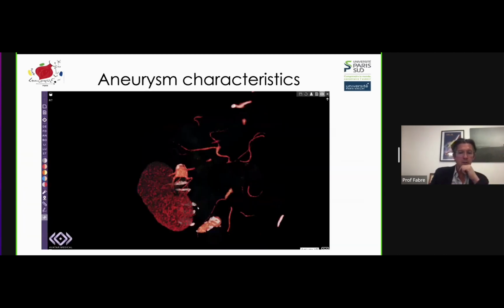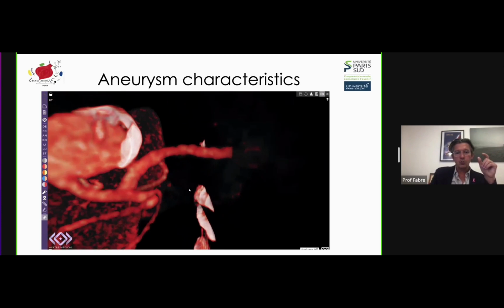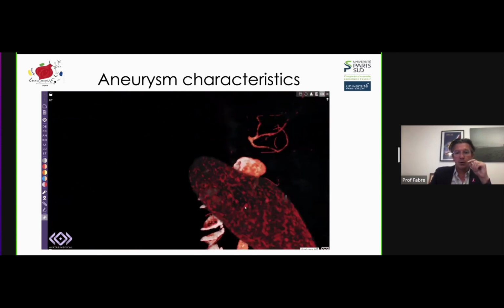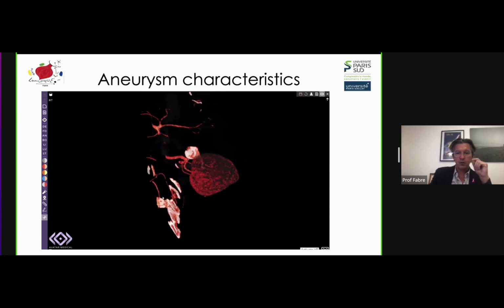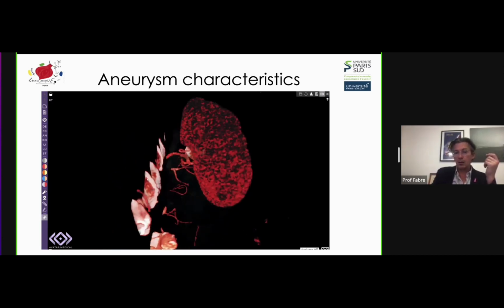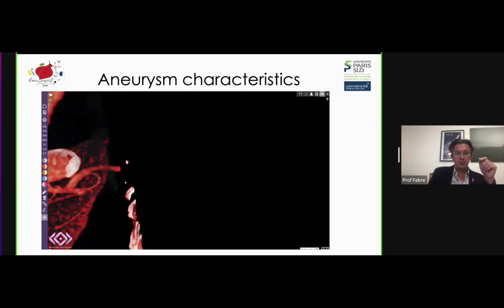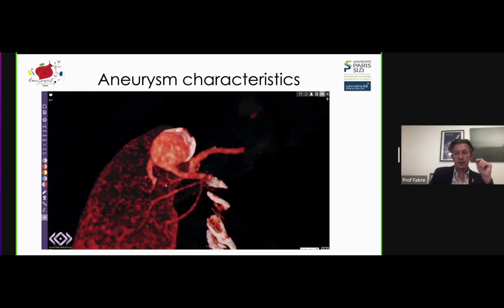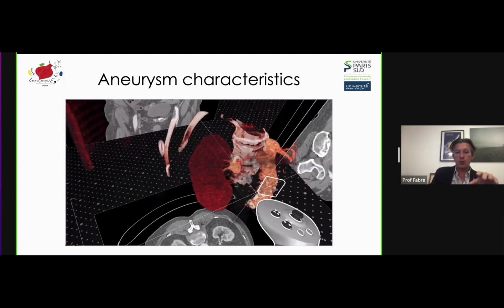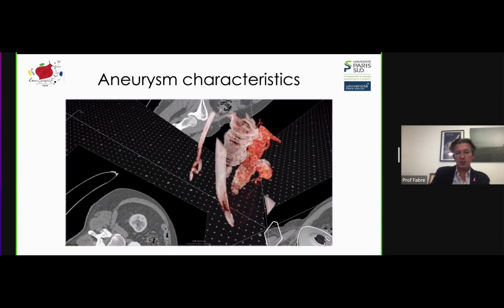But indeed, this is the image that we can have with the Avatar, but you need to imagine that it's a 3D view, and you can see all the afferent and efferent branches, and what kind of branch you can keep. I think it's the same approach for cerebral aneurysm. For cerebral aneurysm, you need to keep all the branches patent, and it's more challenging, but in this case, in a patient with a bad renal function, we also need to keep all the branches patent. So you have this view, like Elodie has shown. You have a 2D projection on the anterior and lateral part of your screen, and you can see the small aneurysm.